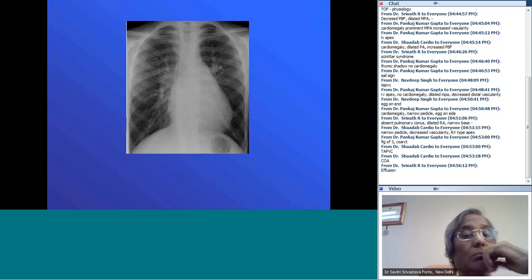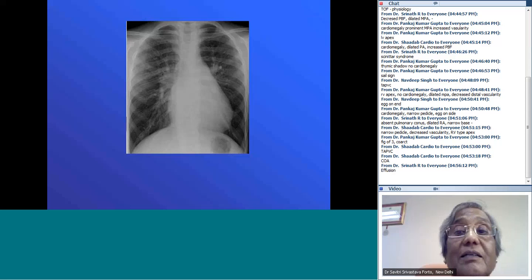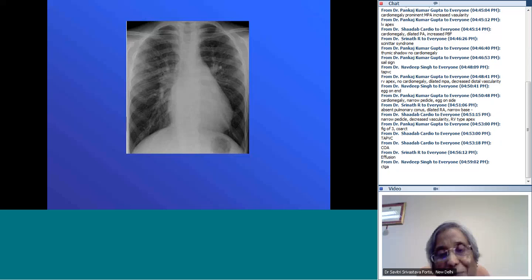No volunteers. There is not an interactive session. Okay. Nobody describing the X-ray? I have to describe the X-ray and give you the diagnosis.